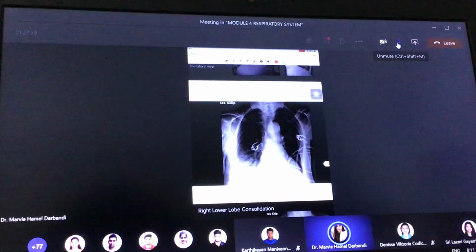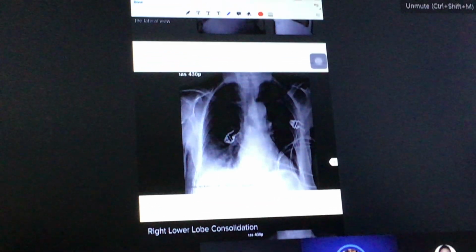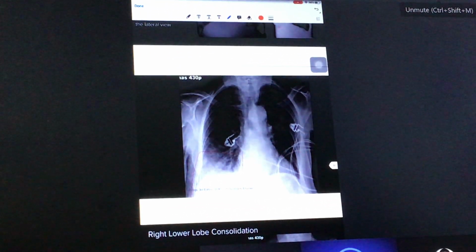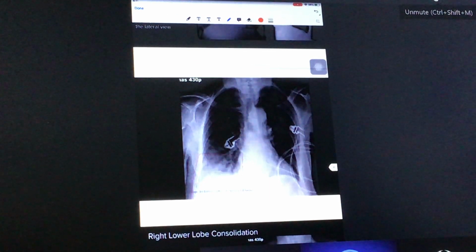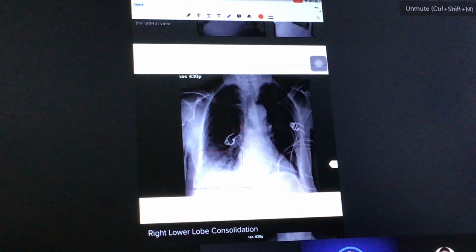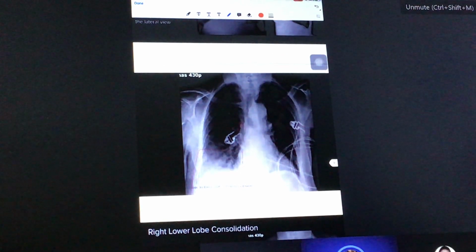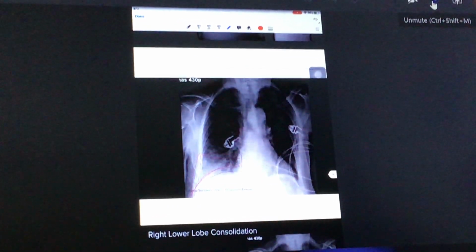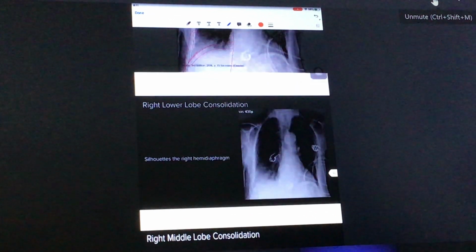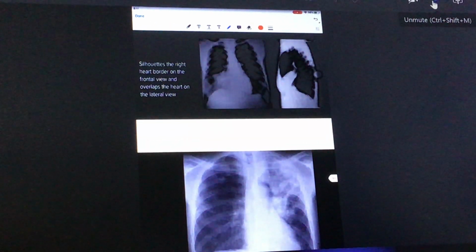Right lobe. This is right lower lobe. The hilum is a little bit far, and it's nearer more to the diaphragm. So, okay, you just read and check all of the lesions because it's already given there. I would like to move on with the other lesion aside from pneumonia.